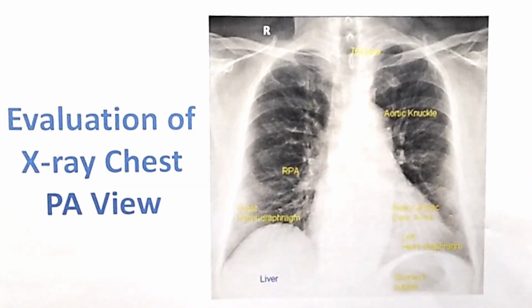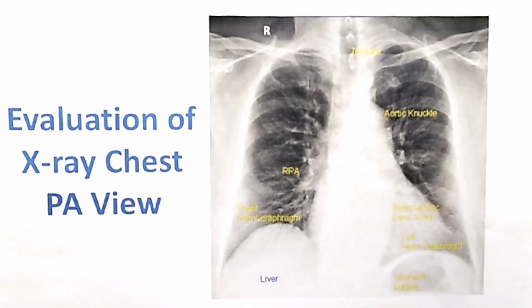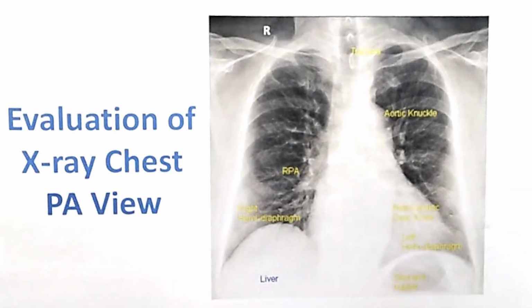Then sometimes there can be coils implanted in the ductus like here, or there could be major aortopulmonary collateral arteries which have been coiled in congenital heart disease. Then you could have pacemakers or implanted devices. There could be devices in the pectoral region, pacemaker or defibrillator or cardiac resynchronization therapy. Then you will see the leads also. All these we will cover in later classes because there are images to be shown.